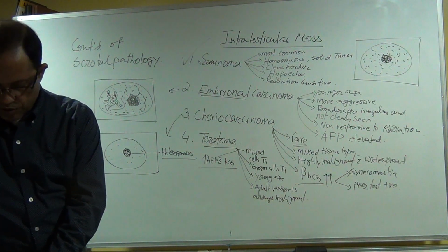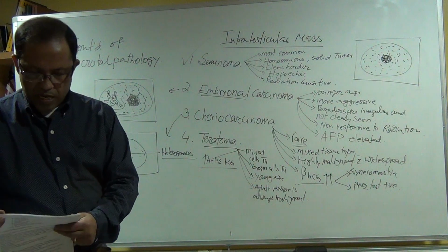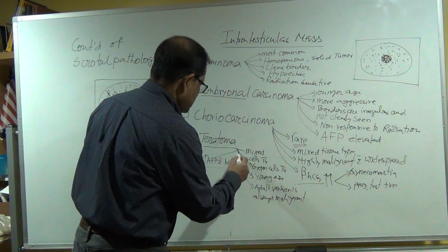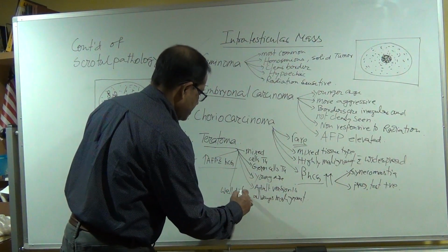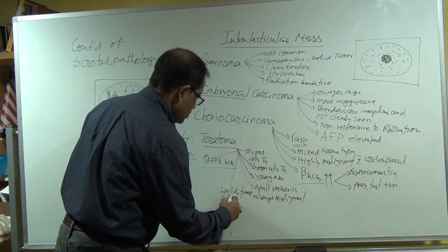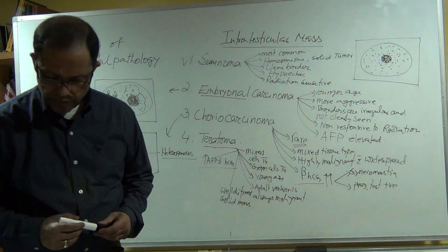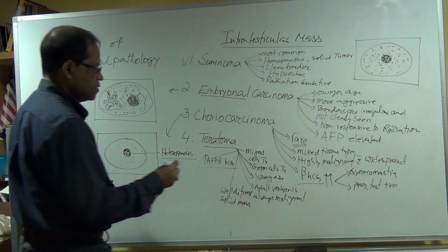Okay, so these are the cancer varieties, and it is a well-defined solid mass. You can write down: well-defined solid mass, and heterogeneous, definitely contains calcification.